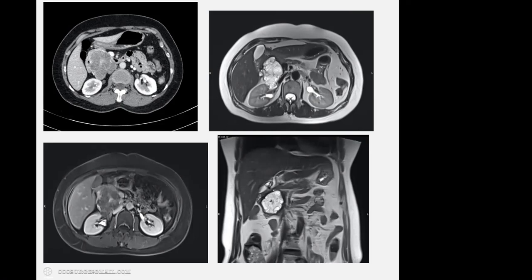Because I told you, when you see an MRI of abdomen, you would see the structures containing fluid, like stomach, spinal cord is a consistent area where you can figure out which sequence this is. The spinal canal containing CSF is bright here. This is gallbladder, which is again bright, and this is the dilated left renal pelvis, which appears bright, hyperintense. So this is T2 weighted sequence.